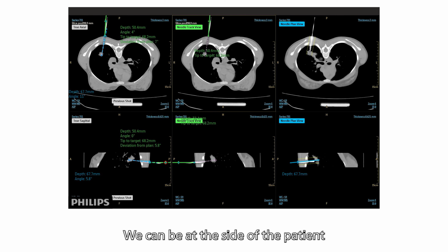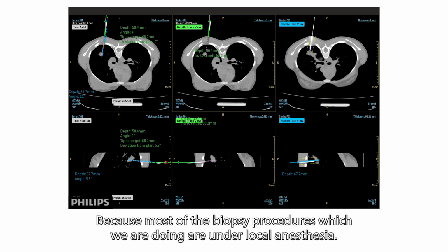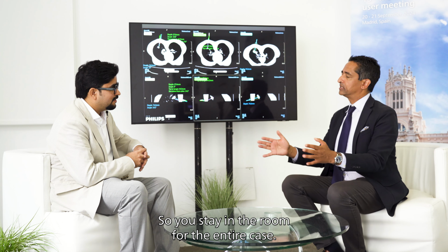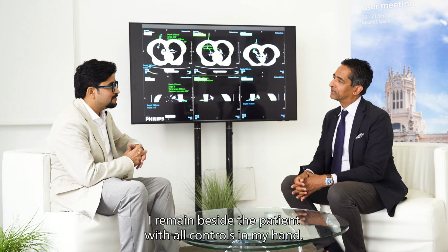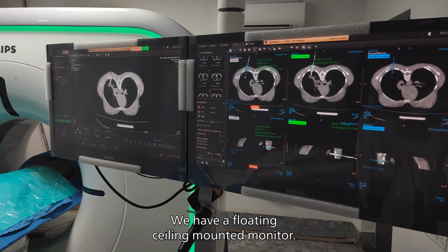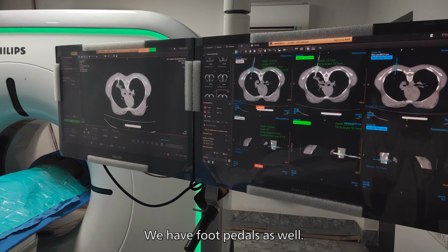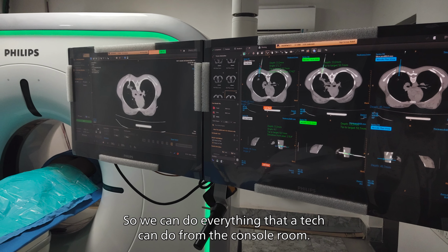We can be at the side of the patient so the patient is more confident on the biopsy procedures, because most of the biopsy procedures which we are doing are in local anesthesia. So you stay in the room for the entire case? Yeah, I remain beside the patient with all my controls in my hand. We have a gantry side monitor, we have a floating ceiling mounted monitor, we have foot pedals also, so we can do everything which a tech can do from his console room. We can do all these things from the table side of the patient.